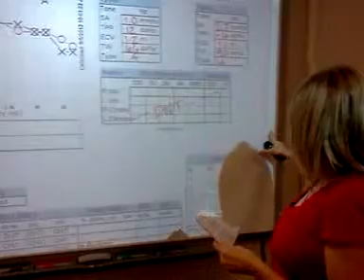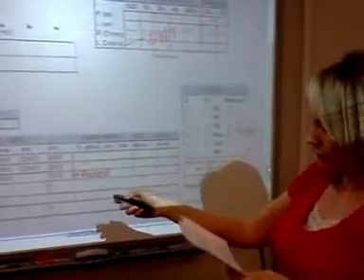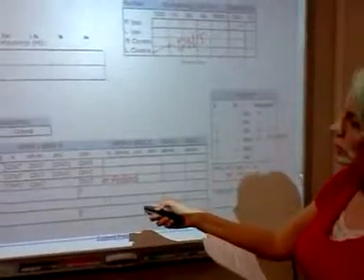At the very bottom of the audiogram report is a bigger chart that calculates the speech detection threshold, SDT, or speech recognition threshold, SRT, and the word recognition score, WRS. The word recognition score is also known as the speech discrimination test. And the purpose of this particular test is to identify a person's ability to understand speech when presented at a loudness level that is well above their threshold using single-syllable words.